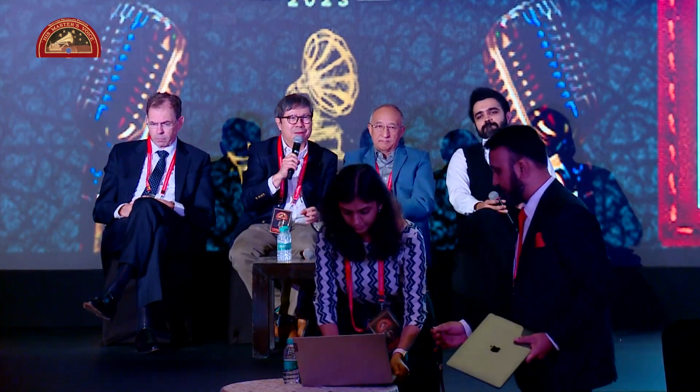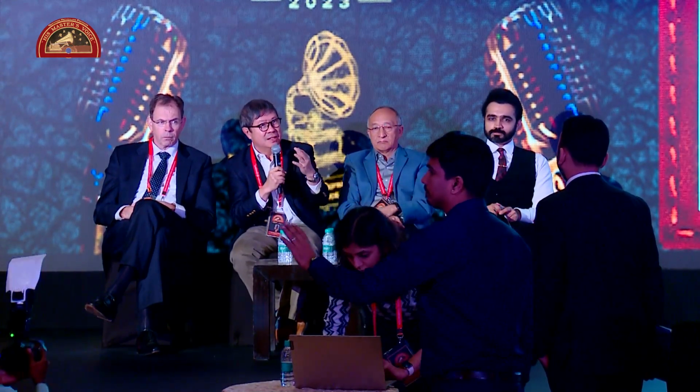While she's setting up, Himanshu, could I just ask you a very basic question? For the Barrett toric calculator, there's the integrated K calculator in which we input 3 sets of K data, and often I do use the Pentacam SIM K as one of my 3 sets. Is that appropriate? Given that the IOL Master K and auto K, which is the other side, are different. What's your comment on that? What should we be using?